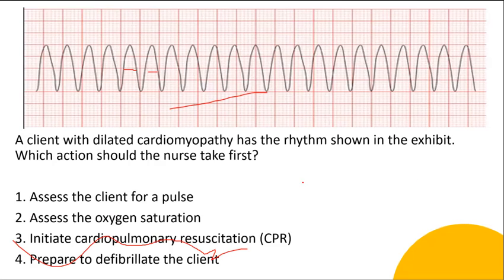Okay, so again, number one is going to be my correct answer. I need to determine if this is a pulseless ventricular tachycardia, or this patient has a ventricular tachycardia and has a pulse. So number one is going to be my correct answer.